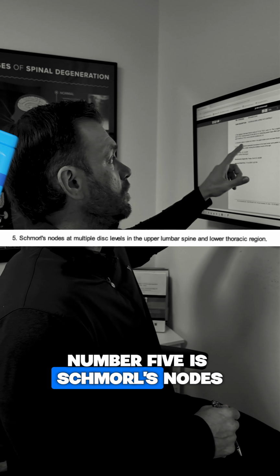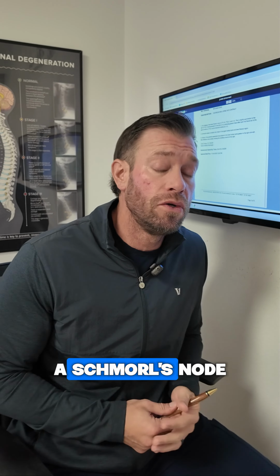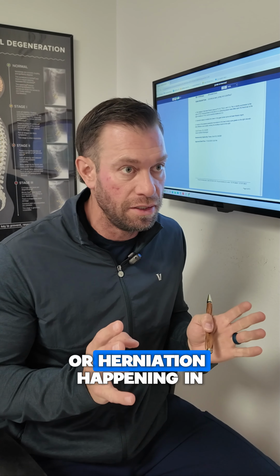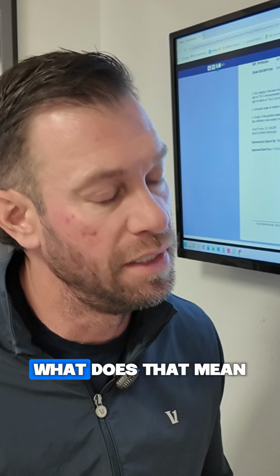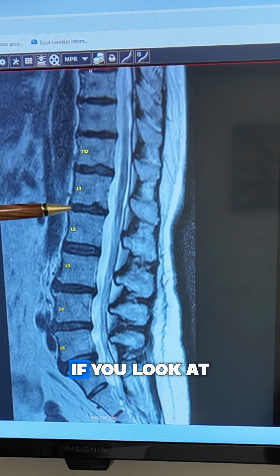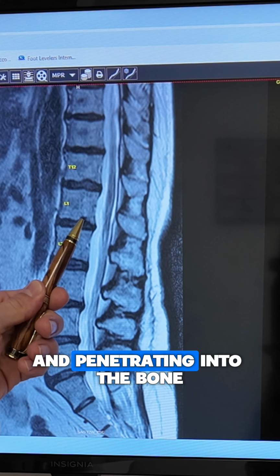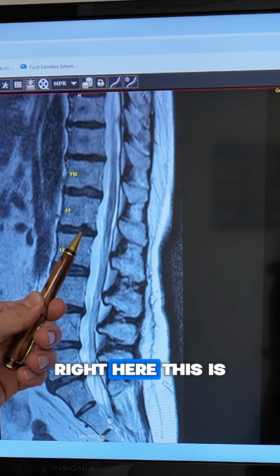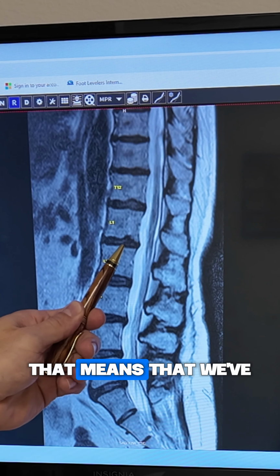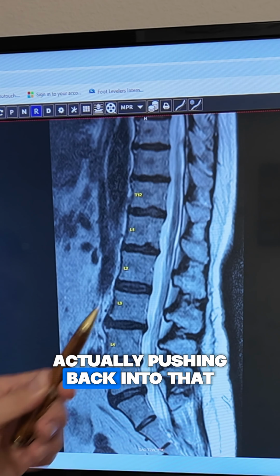Number 5 is Schmorl's nodes. Again, another amazing term that people just have no idea what it is. A Schmorl's node identifies that there's actually a disc bulge or herniation happening in a different direction. What does that mean? Instead of the bulge going back or forward, if you look at this little dent right here, the disc is actually going up and penetrating into the bone right here. This is a very, very chronic disc condition. That means that we've created a weakness in the bony structure, and the disc is actually pushing back into that.